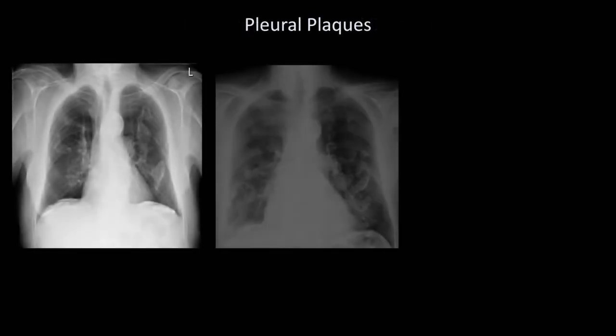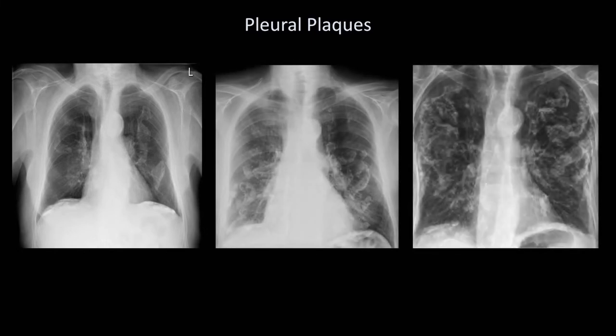These visually fascinating opacities are all examples of pleural plaques. They are typically bilateral, multifocal, and relatively symmetric. Each individual plaque can appear scalloped or shaped like a holly leaf when seen front-on, while those seen edge-on appear more linear. The apices and costophrenic angles are relatively spared.